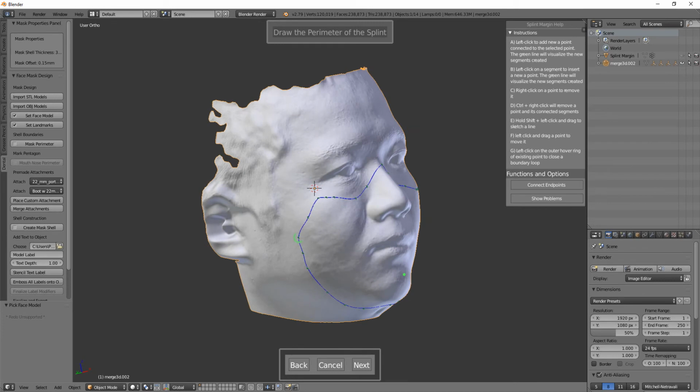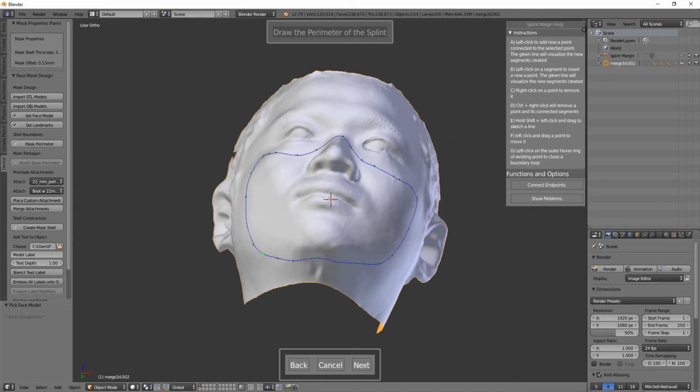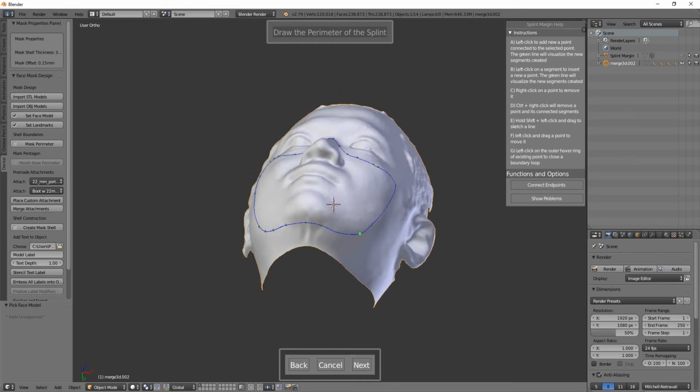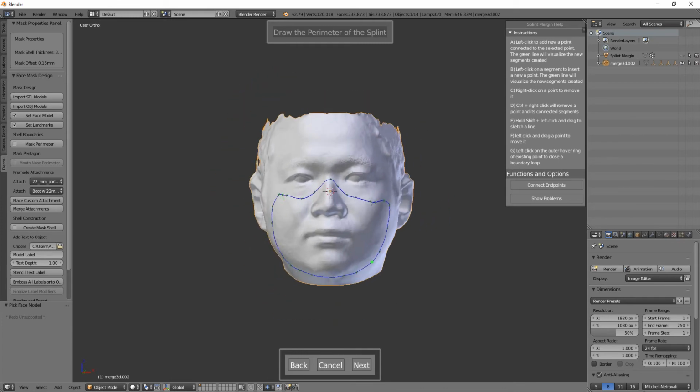I don't know what the best places on the face actually are, because we're repurposing dental software to design a face mask, so I can't speak to the appropriate design, like how much under the chin it should wrap. So I'm hoping other people can chime in with that, but basically you want to make sure you're symmetric, and that you've got your perimeter where you want it.